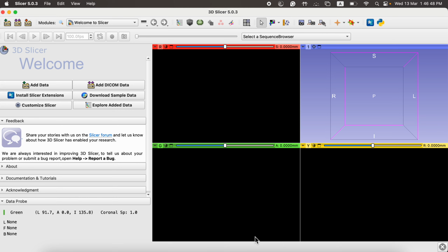Okay, so in this video, we are going to see how we can overlay one image on top of another. This becomes really handy when we are working with a pre-processing problem, or when we want to make sure that if we align two images on top of one another, the objects on those images are properly aligned.